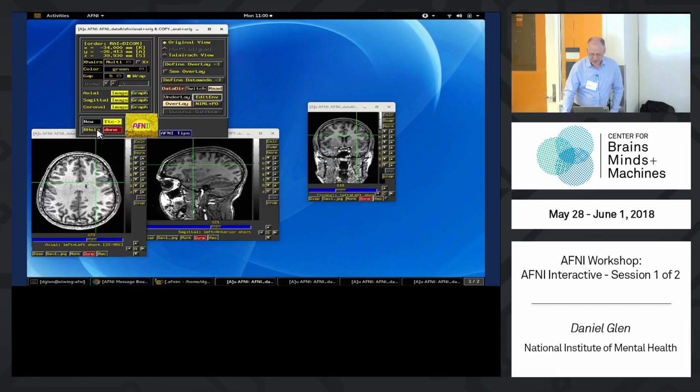All right, let's go. The next thing, I showed you help on the command line. I want you also to know about other places you can get help. You may notice that as you move your cursor over different parts of the image, over the menu, you can get different hints showing up.